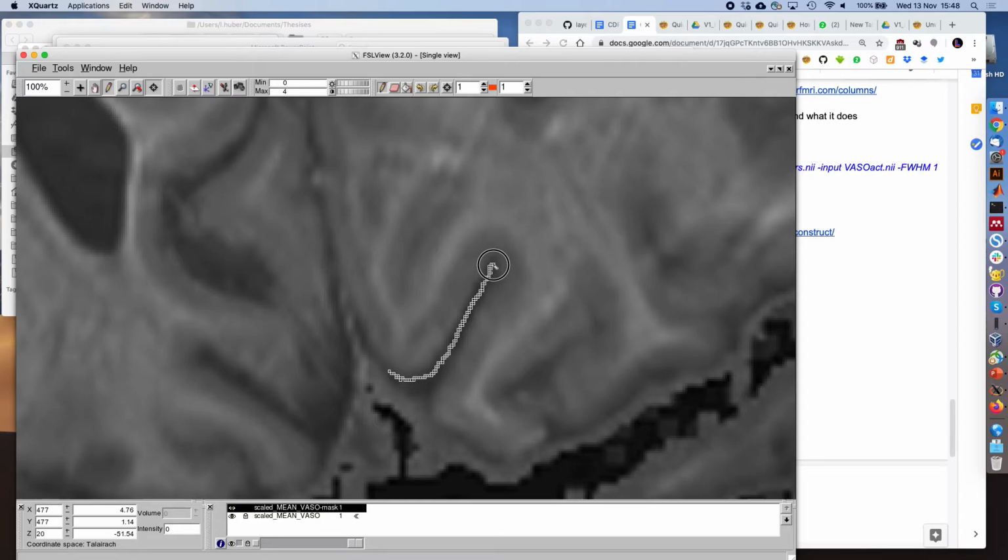I didn't think it was topologically correct. Yes, okay, here's what you do. This is what I'm confused by. So you're not actually drawing a single surface, a single one. You mean that I'm drawing two lines here? But there's 2 lines rather than 1. Right, and that's a serious issue, and I'm not sure if any program can deal with that.